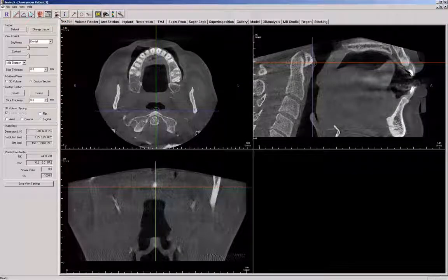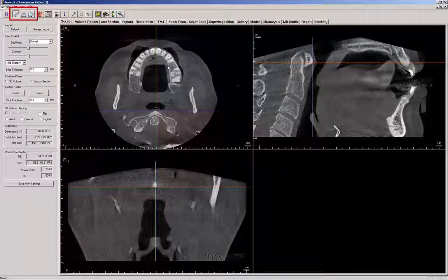The toolbar has three measurement tools. The first of these measures distance. Click its corresponding icon to activate the function. Then left mouse click where you would like the measurement to begin, and left mouse click again where you would like it to stop. Left mouse click on the tool again to deactivate it.